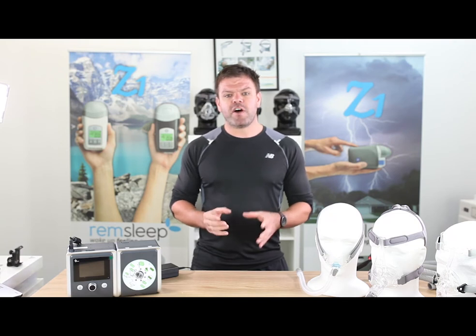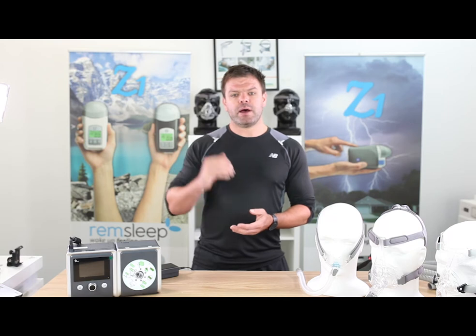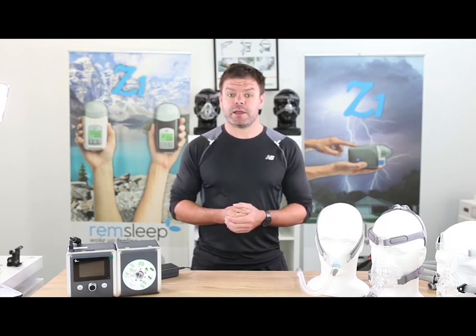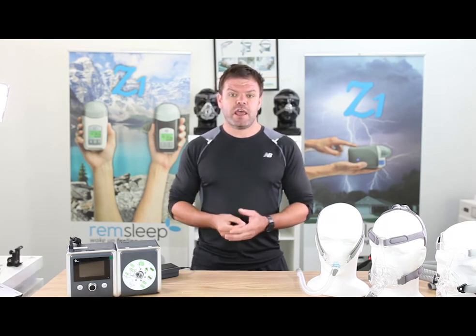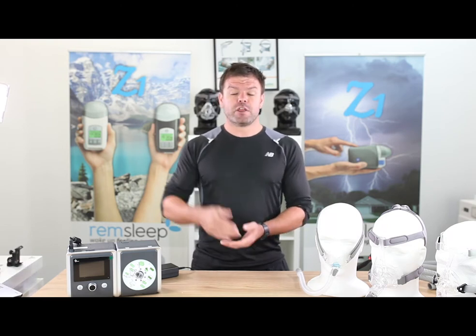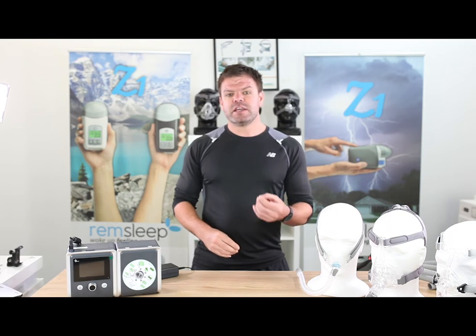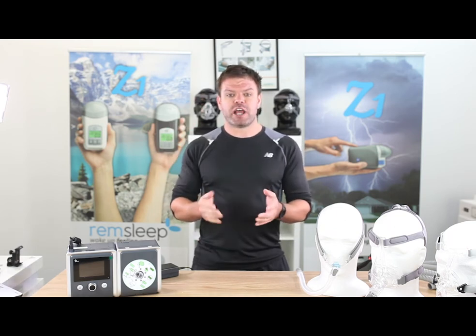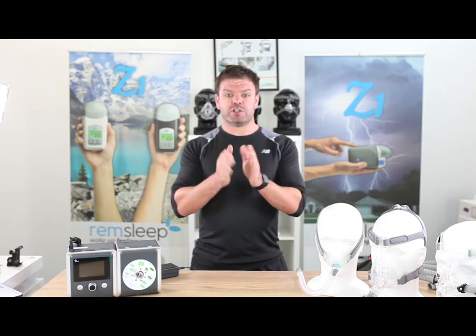The P95 or pressure 95 is a great variable. It tells us what number we need to control 95% of your sleep apnea. For example, if you have a P95 or pressure 95 of 10, it means in order to control 95% of your sleep apnea, the pressure was at 10 or below throughout the night. It gives us an indication of where we can set the max APAP level. The average pressure averages all the different pressures throughout the night and gives you an average pressure.